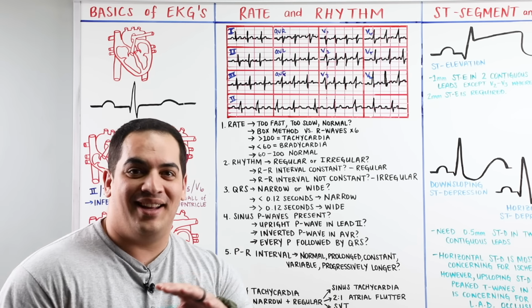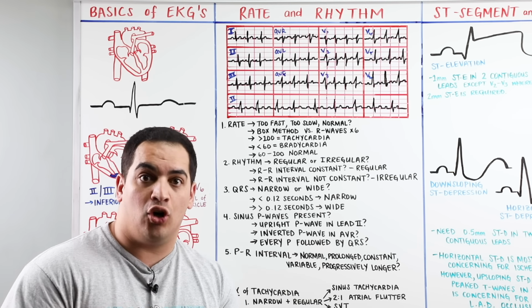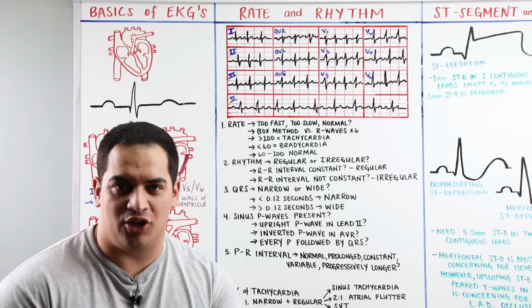All right, Ninja Nerds, in this video we're going to talk about how to determine the rate and rhythm on a 12-lead EKG.